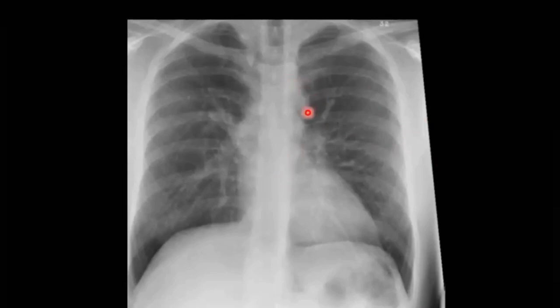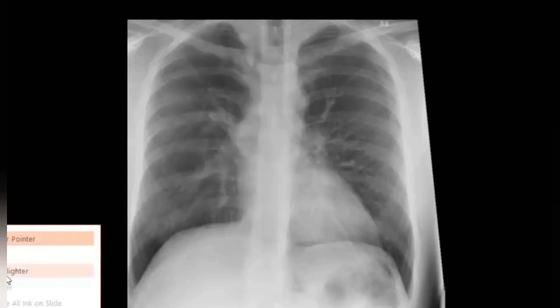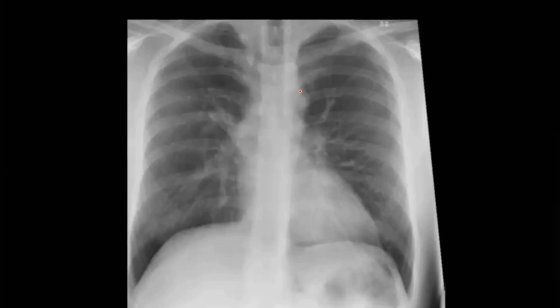What do you call this? Is that narrow cardiac aortic knuckle? Just a moment. Where's the pointer? How can I find it? Okay. Yeah, aortic arch, sir. So what do you call this? It's a figure of three configuration.